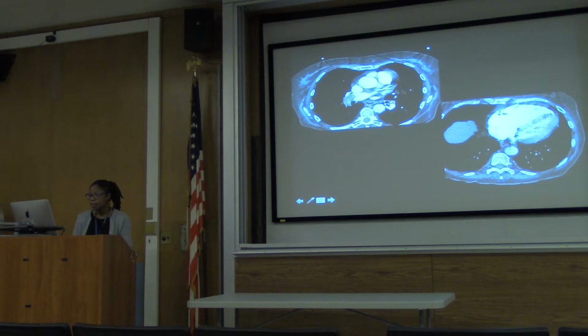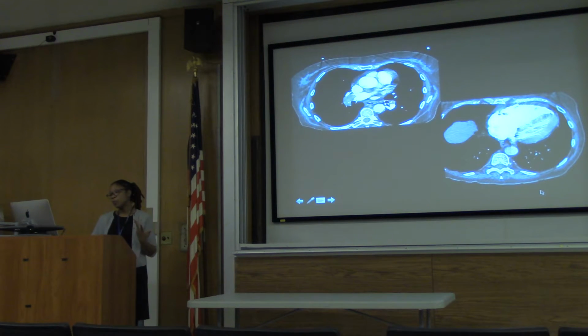Another example here, you can see a large bilateral clot, saddle emboli, and you can see the septum here is rather straight, and the left ventricle is significantly reduced in volume and in caliber, compatible with pulmonary hypertension associated with this clot. And some other things that we can see as well, which is not always reliable, is reflux of contrast into the hepatic veins. That doesn't always happen, but that's something else that we can look for.